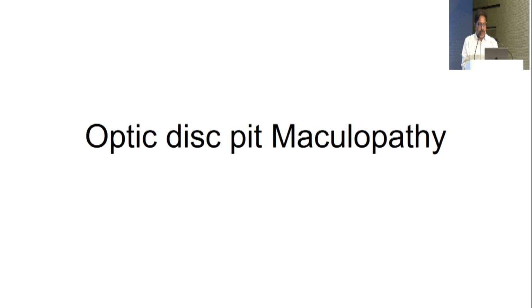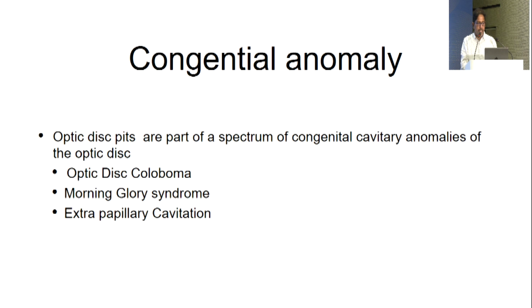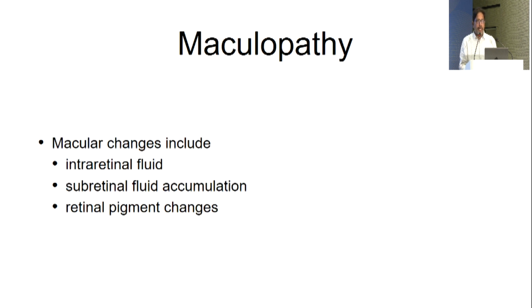Then we'll come to the second topic, that's optic disc pit maculopathy. This is a little bit of a rare entity, not seen commonly, and this is one of the congenital anomalies of the disc, which comes under the optic disc coloboma, morning glory syndrome, and all those things. It comes under the same scheme. Here you can see that the fluid accumulation happens in both the intraretinal and the subretinal space, along with changes in the RPE also.